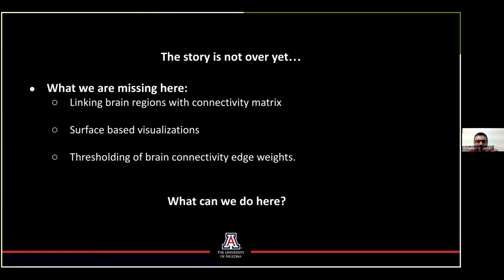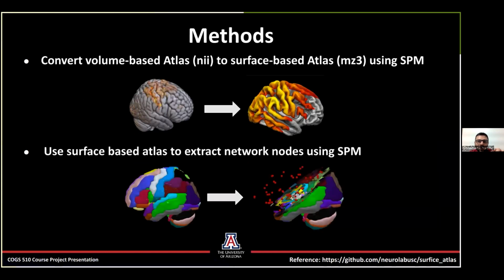Since this is an 88 by 88 connectivity matrix, 88 squared is the theoretical number of edges we can have. But what to do if you're not interested in all the edges, but just the densely connected regions? The idea is that you can use the Surf Ice software to overlay. I'll start with the basics first.